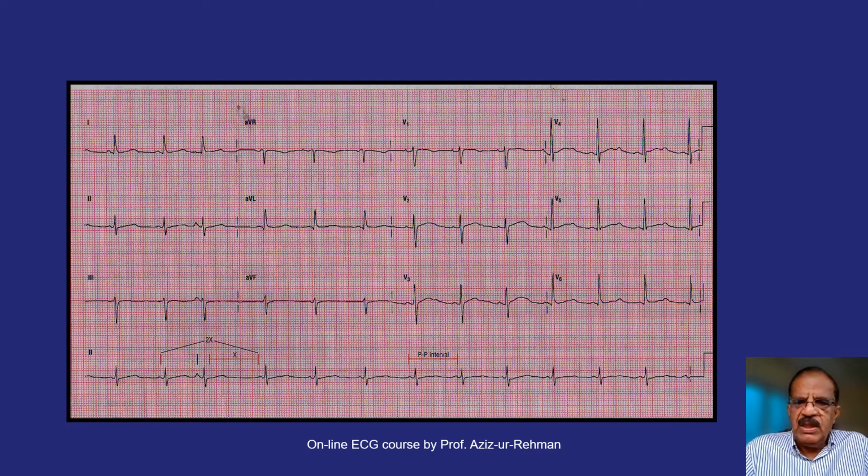Now, this is the ECG, and let's examine it like we normally do. 1, 2, 3, AVR, AVL, AVF, V1, V2, V3, V4, V5, V6. But first, since we are discussing ectopics and ectopics relate to rhythm, we must examine this one. So this is the rhythm step. Normally, like when we walk comfortably, leisurely, all steps are equal, right? This is the normal thing.